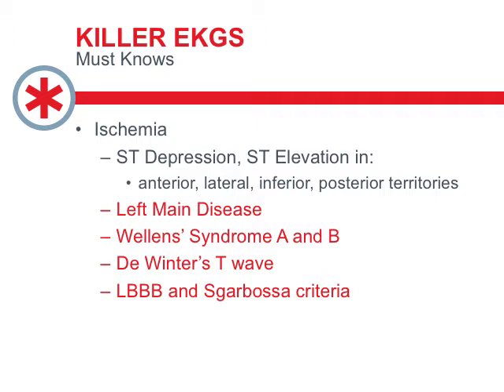So obviously we need to basically be real masters of the ECGs that show ischemia. We talked earlier about the classic forms of ischemia with T-wave changes, the ST depression, ST elevation, and being able to talk about what vascular territory those are in.